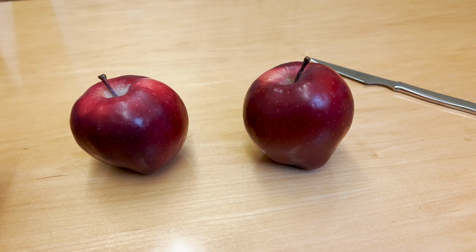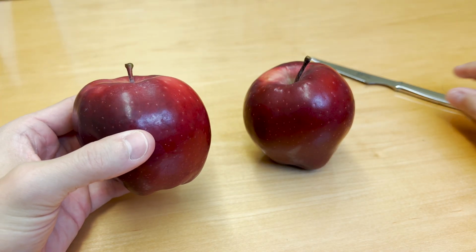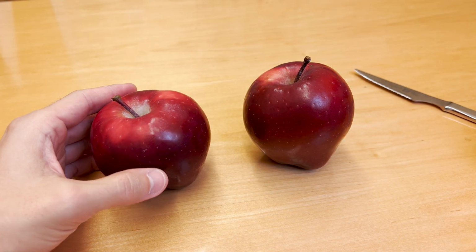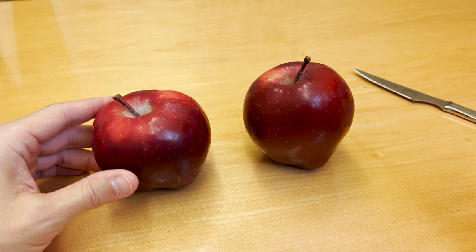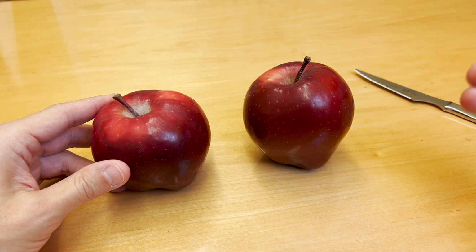Okay, so to help understand how we interpret imaging on the MRI scan, I've brought some fruit here to show how the MRI actually makes slices through the images. So I think this will be really helpful in order to begin to understand how to go through an MRI scan and understand how the images are produced.